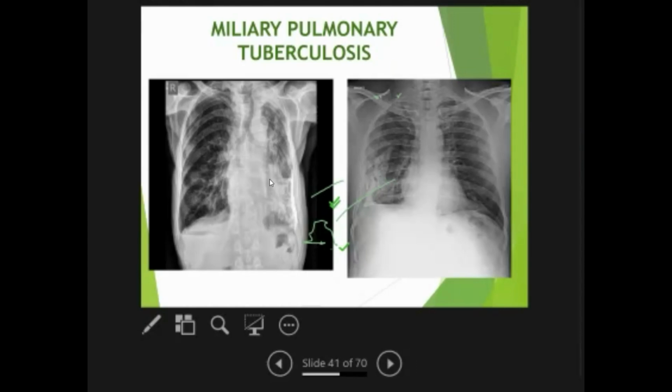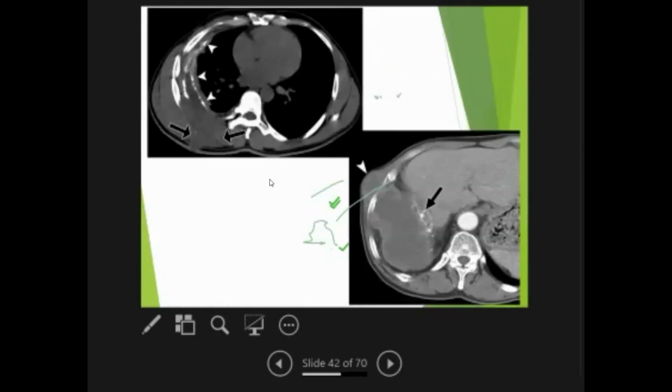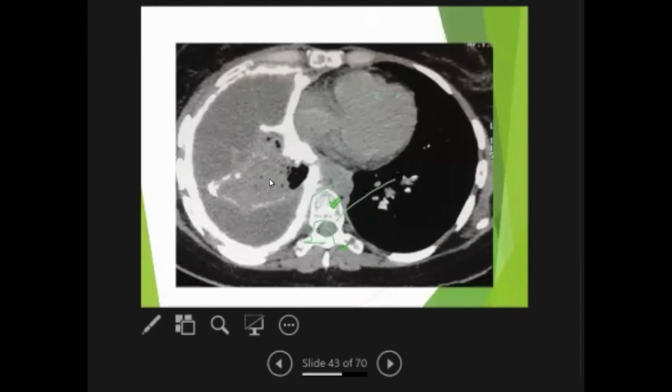And this is pleural calcification, a late sequela of pleural effusion. You can see this high density area along the pleura, and then a wedge-shaped area in the lung. And here also you can see the pleural calcification. And this is a patient with chronic pleural effusion with calcification. This arrow shows a cutaneous fistula formation, where the empyema is extending through the skin. And this is another patient with chronic empyema with calcification. This is the gross calcification of the pleura with the empyema, an old empyema.